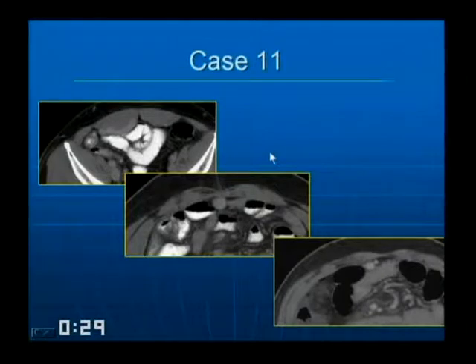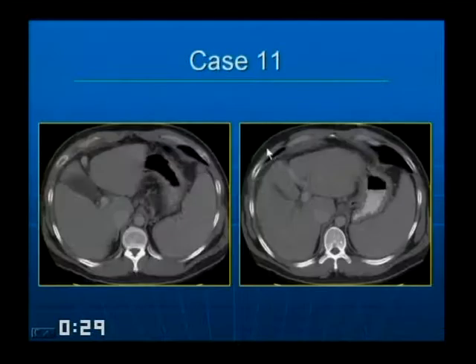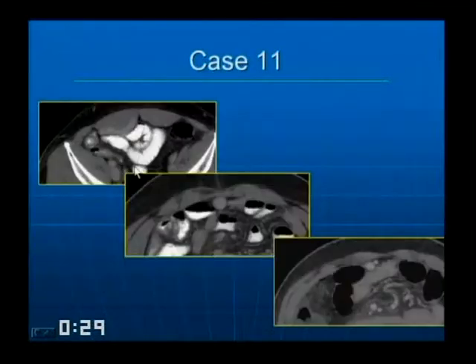This particular case is really designed to discuss portal hypertension and cirrhosis, which Dr. Barron covered in his lecture. And just remember, there are a whole host of pathways. You'll see some very nice articles in the literature summarizing the various pathways of collaterals. In patients with what's called a patent paraumbilical vein, sometimes that vein, and these are the top cuts from this particular case, I'm going to just go back, can continue down and you can actually follow that draining into the right femoral vein. I was able to follow that all the way down.